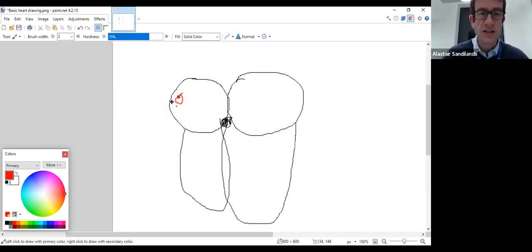Right, so if our sinus node doesn't work properly, then you get sinus bradycardia. It doesn't penetrate out properly through the atrium. So it might be a slow heartbeat, but you will still see a P wave. So with sinus bradycardia, the sinus node is still working.